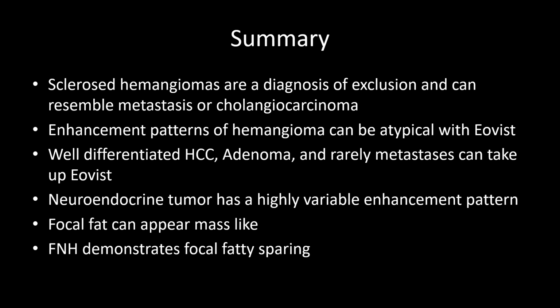Focal fat can be very tricky. Don't forget it can be mass-like or micronodular in addition to the geographic areas or more diffuse steatosis that we are all familiar with. Focal nodular hyperplasia does not contain fat. It shows focal fatty sparing. So when there is a background of diffuse steatosis, it will be hyperintense on pre-contrast imaging, and it will remain hyperintense on subsequent phases of contrast, including your hepatobiliary phase.